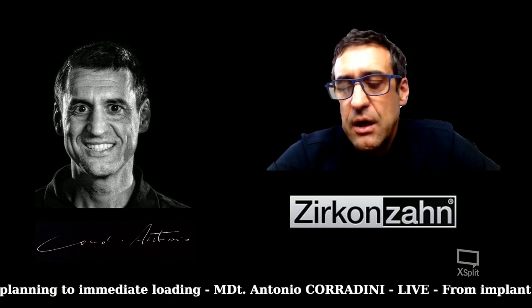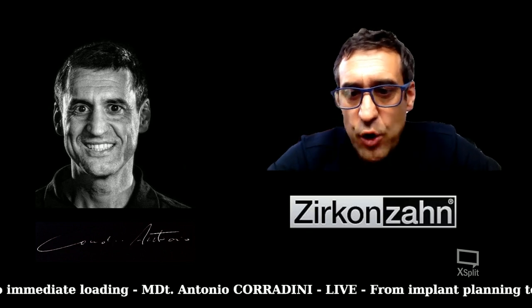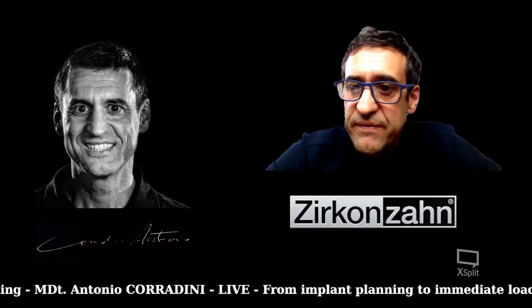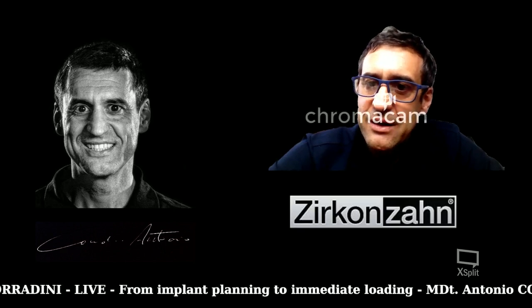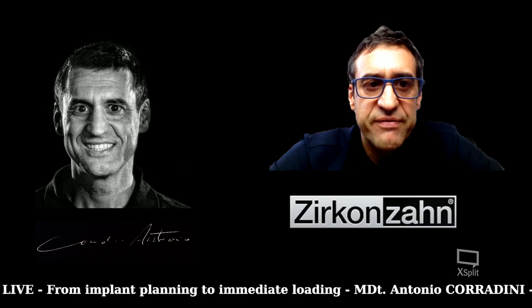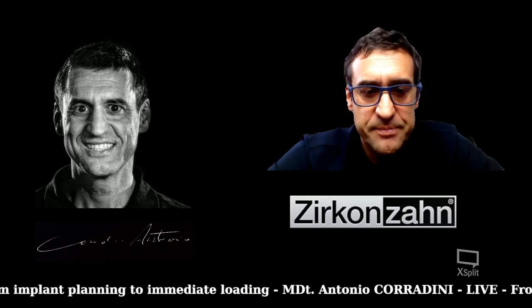loading. So we will touch different software starting from the project, so the archive, then the scanner software, the implant planner, the modifier, which is the newest software we have. And you can also see that we can create really easy setups in the modifier software. And I will show you how during this case.